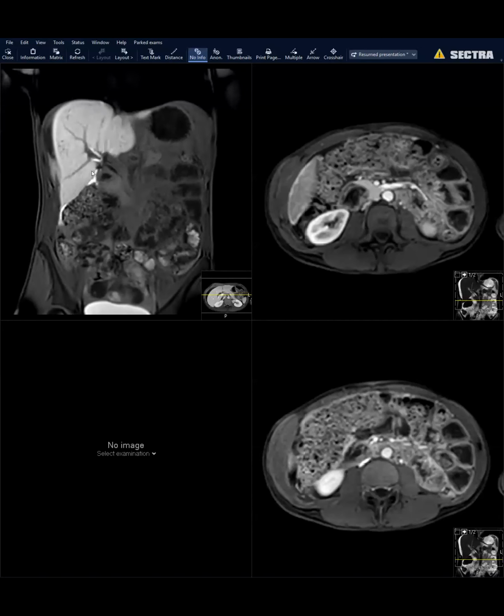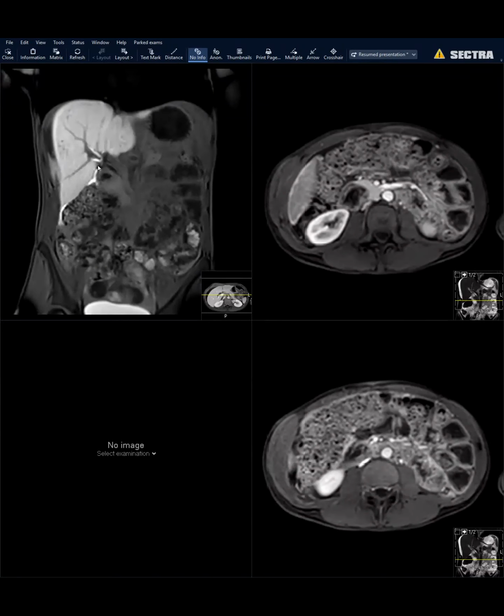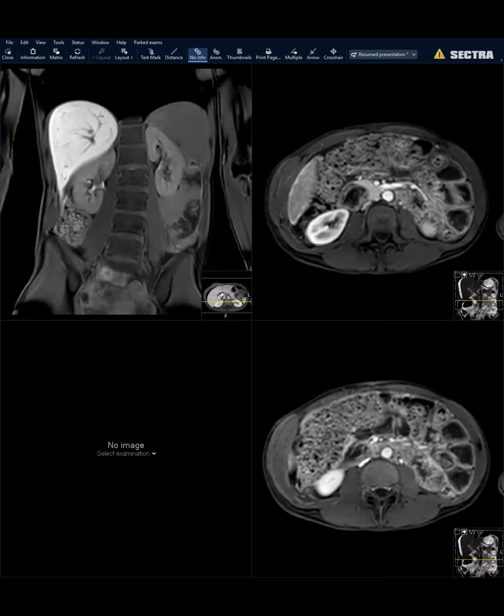Right. And I think this was like that tail-like communication, like Nelly said, we saw go to the hilum, which may be from the cystic duct stump where this leak was coming. So this was another cool case.